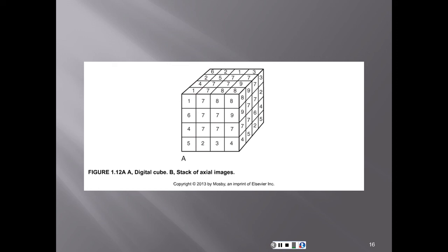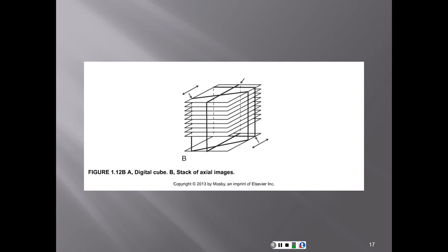So the post-processing technique depends on creating a digital data stack from the original 2D images, thereby generating a cube of digital information. So you have an analog image that you're taking a picture of. Once you take the picture, the computer, through the Fourier transform, turns it into a digital cube stack of numbers, and then an inverse Fourier transform is applied to it, where it's depicted back to you in an analog format, anatomy that you can readily identify. And remember, it's a stack of slices that are combined to demonstrate anatomy.